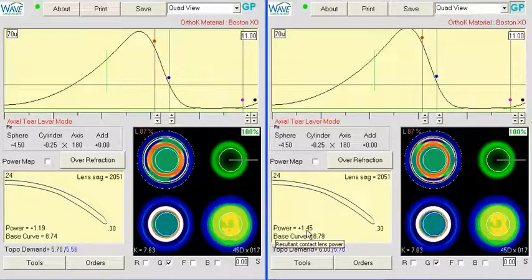The patient might have a little bit of a minus over refraction first thing in the morning, but I don't think it would be long lasting, and I don't think it would affect vision. But since we do have the history, we can extrapolate this data, and a target of 1.95 I think is pretty reasonable. So I would just, in 100% mode, click up until we're at pretty close to 1.95.